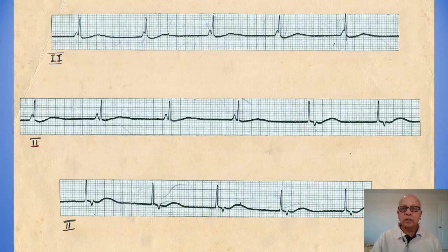So friends, we'll go on to the discussion of this ECG. I gave you a little more time because I know that there are 4 questions. The 4 questions which I asked were: what is the diagnosis of the arrhythmia? What is the cause of the arrhythmia? What investigation you will do? And what will you do for the patient?